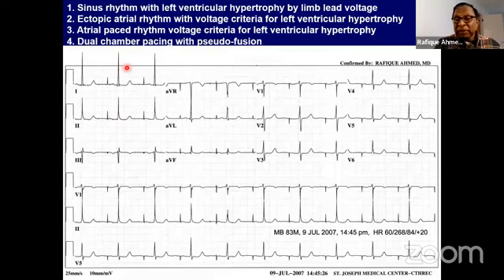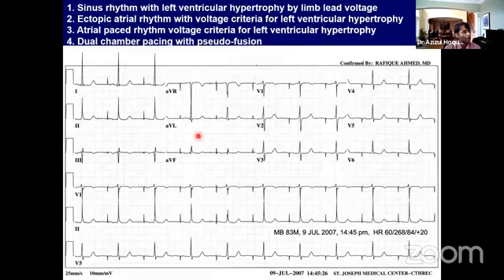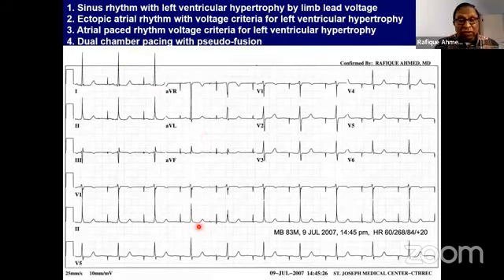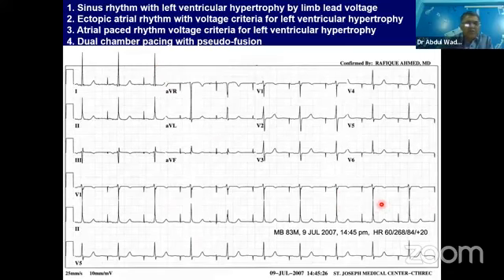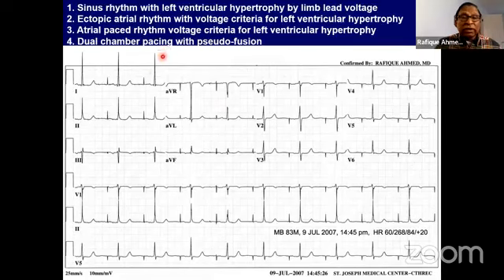Thanks, Jamil. And another point I'd like to make, look at the rhythm strip 2. You see that one is different than the other ones. Look, this is taller, this is short. Also, V5 shows some are bigger, some are smaller. Exactly. So remember that how the signal looks, it doesn't look like an R wave in lead 2.